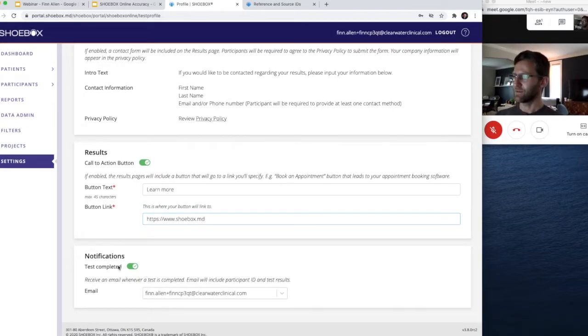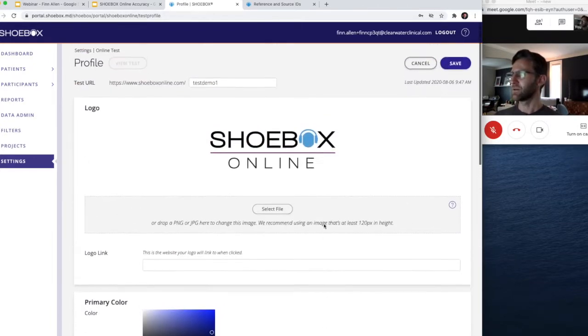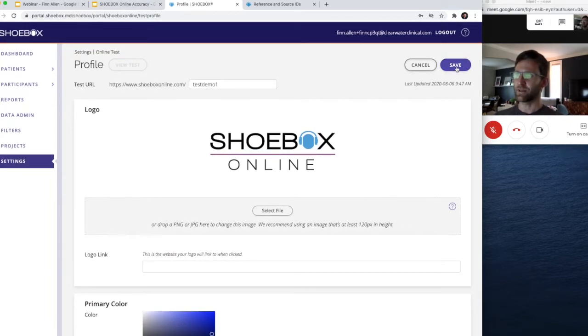And lastly, I have notifications turned on. So this is when the test is completed, I'll get a notification, and if they left their contact information, that information will actually be left in that email direct to you so that you can follow up with that patient immediately. So we're really trying to give you the tools to engage with people when they're thinking about it, not 4 hours later or two or 3 days later. They're curious right now, let's help them. So after you've changed all of those settings, you can go up here and you can click save.